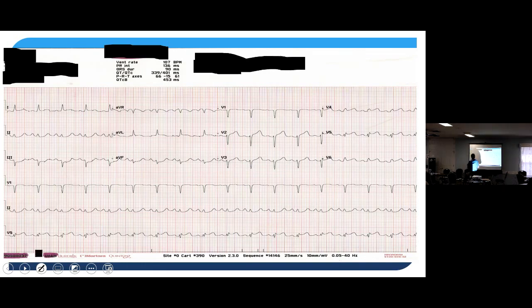So this is our second EKG. I would say this one is more concerning. We already knew we were up in AVL. I look over here at V5 and V6, and now I got what? ST elevation. So now she is STEMI'd out, right? So in my mind, I'm still going to look at 2, 3, and AVF, and V1 through V4. I'm not looking as thorough because I've already got my diagnosis, right? So now she's a STEMI.